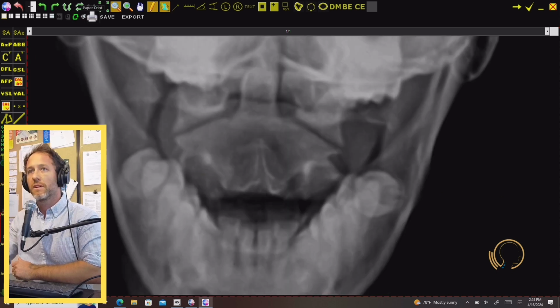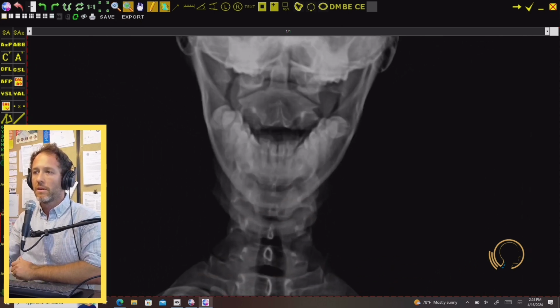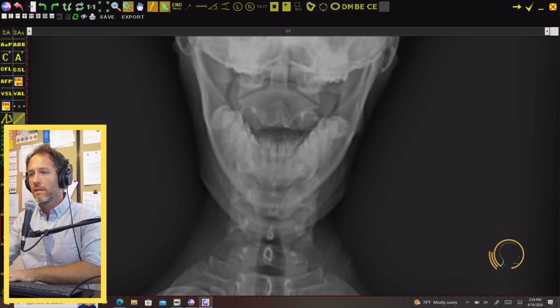So other than that, your axial view is going to function as a secondary reference for your frontal film, which, watch the frontal film video if you want all the dots and all the information. But in terms of locating your C2 spinous process, it's really nice having that open mouth that's clean to look at, and also for measuring the lateral margins of the C7 body.